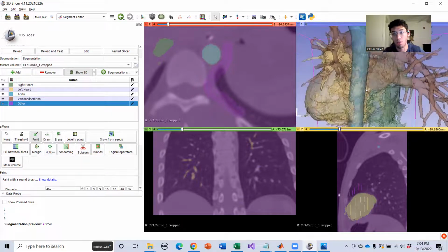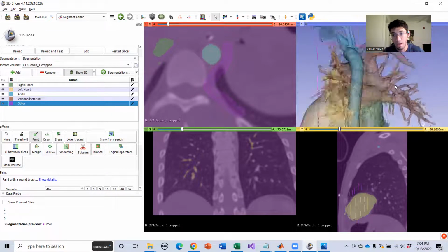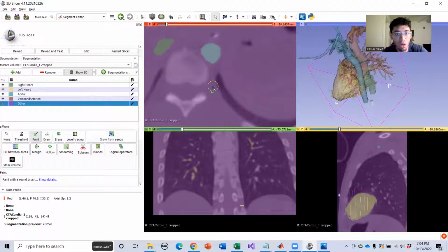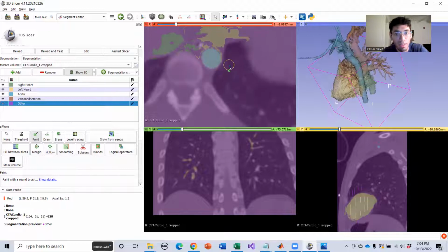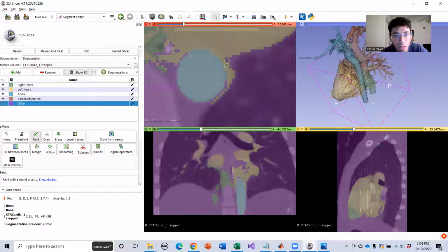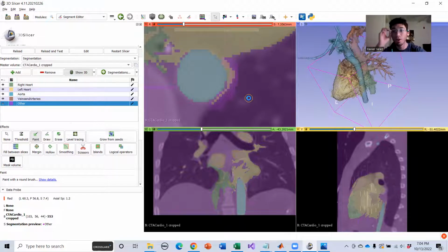Not all of it, but most of it is gone, right? So the aorta is cleaned up a little bit. Maybe I'll do one more cleaning up the aorta where I take these few pixels and say, hey, you guys are not invited. Get out of here. All right. And hopefully you'll see that blue stalk of the aorta starts to get a little cleaned up as well.